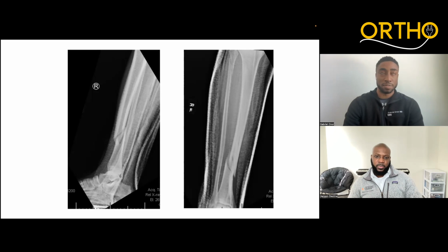And this is potentially more useful in the days in which patients would not proceed to the operating room with shaft fractures. Oftentimes these, many years ago, could have been treated non-operatively. And so if this were to be treated non-operatively, definitely it would need a long leg rather than a short leg.